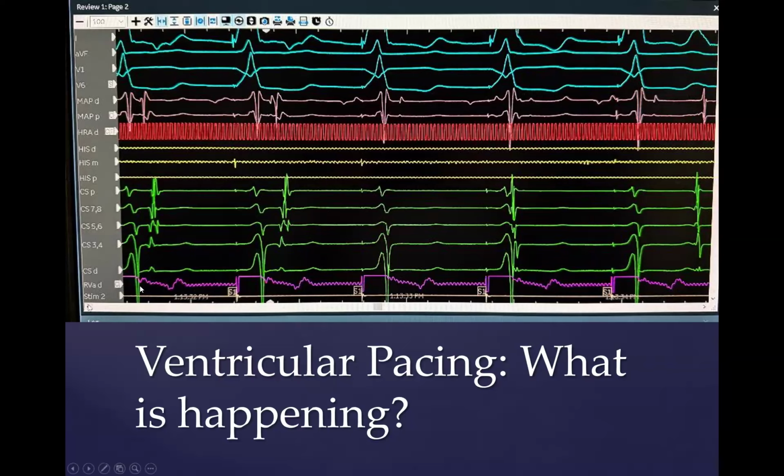Yeah, and the following one is the atrial ones. In other words, you're saying this is the V, and this is the A. Yeah, I agree with that statement.